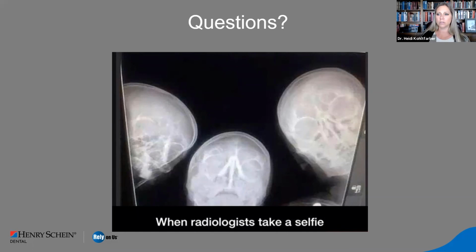Like any pathology, it's going to follow the path of least resistance, and it can easily expand into that sphenoid sinus. So if you notice it is larger than the size of a dime, with a hydrostatic appearance and expansile borders that look like they're impinging on other anatomical structures, of course we want to send that patient on for additional imaging.